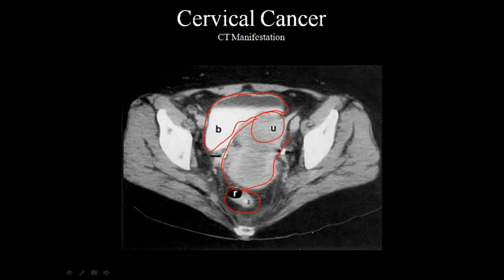It's kind of pressing on it, but that's not uncommon with the uterus, especially depending on what type of childbirths a patient has had, and if you have some abnormalities with the uterus already. But we do see that there is some degree of enhancement here on the outside edges, which can simply be the outside wall being enhanced. But it does seem to be slightly enlarged. But once again, we cannot diagnose this as being malignant cervical cancer.